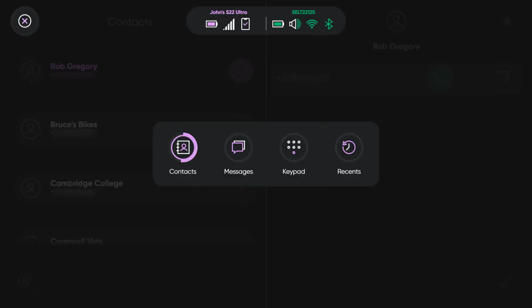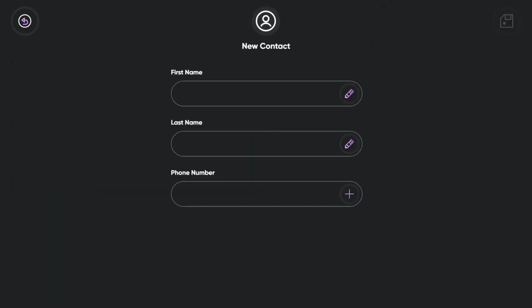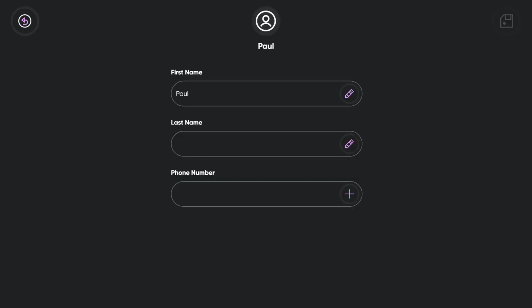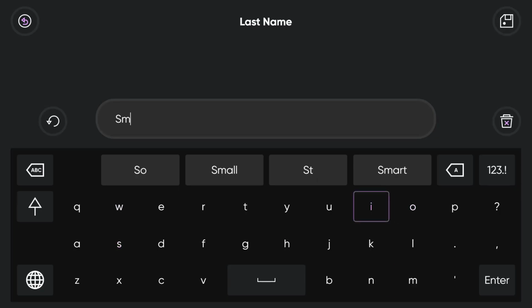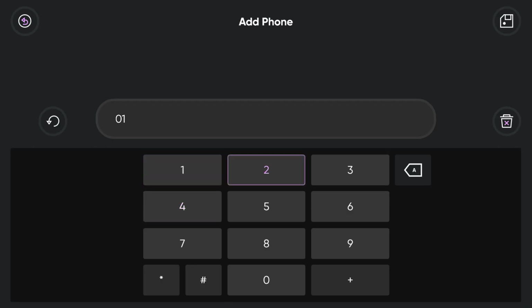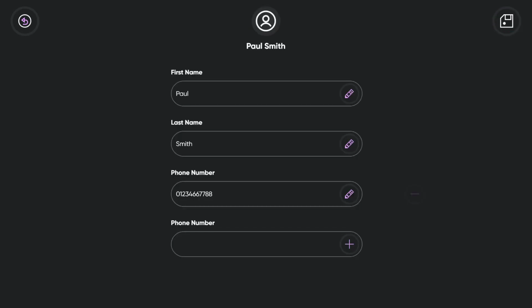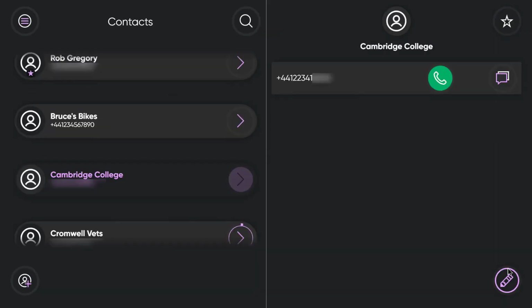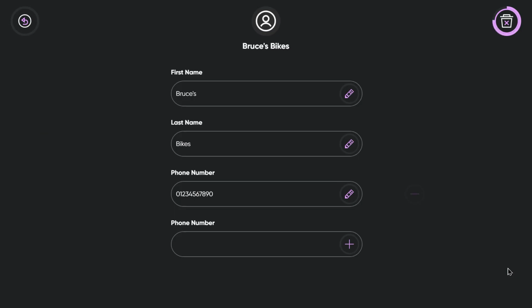Contact handling is something our users will be excited to hear is now possible within TD Phone. It used to be that users would need to ask someone else to edit the contacts on their physical phone and then sync them to TD Phone on their i-series. However, in the latest update, users can now add, edit or remove contacts directly on TD Phone. It is also possible to assign multiple numbers to one contact. We feel that contact handling is important for a user's independence and privacy.